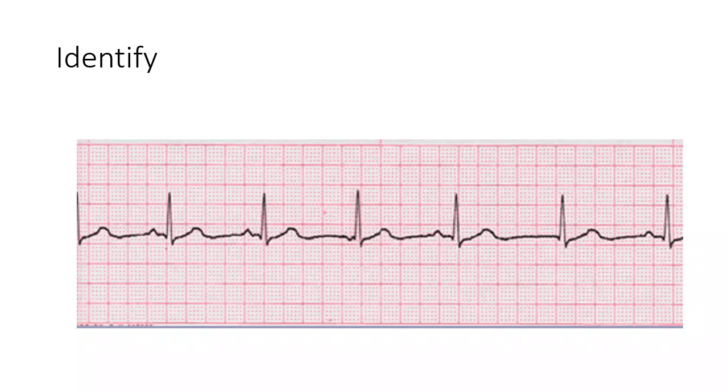So what do you think? Is it junctional rhythm? Let me ask you, why would you call it a junctional rhythm? Do you see P waves? I see two of them that are inverted. Two of them are what? Inverted. Ah, what else do you see?